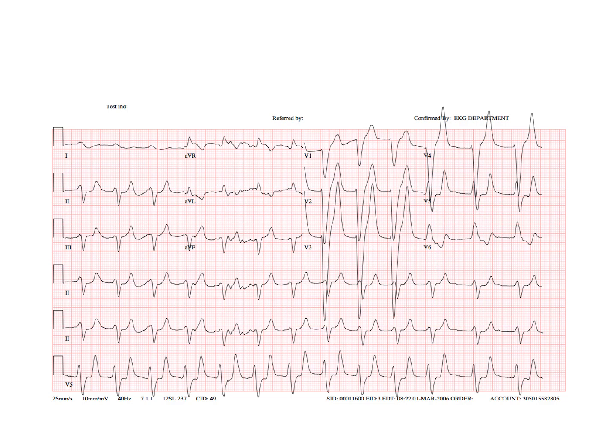What you will also notice is the QRSs are wide, but if you go through our checklist for the left bundles, you'll see that it doesn't quite fit the bill. So anytime that you see a wide QRS that is slow and it doesn't look like a left bundle, start thinking about hyperkalemia. You'll also notice that the T waves are really tall, especially in the precordial leads, and that there are no P waves.